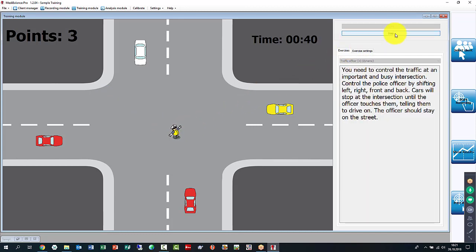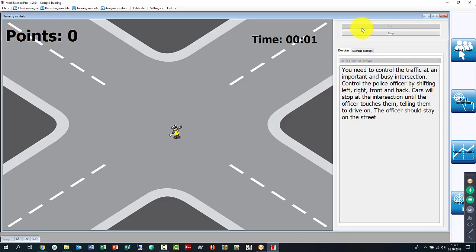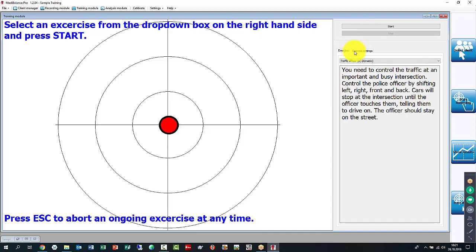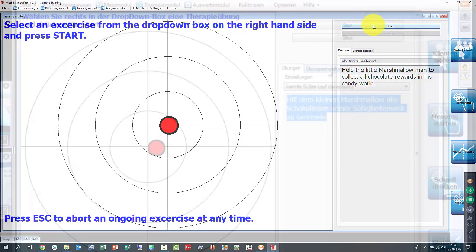You have a lot of setups. You have your traffic noise background in here, and you can do the same thing again as a cross. So same kind of scenario. Now it's not just front, back, left, right, but it's a combination thereof, as it was before in the sewage. Okay, the next two are 3D games that we've created.